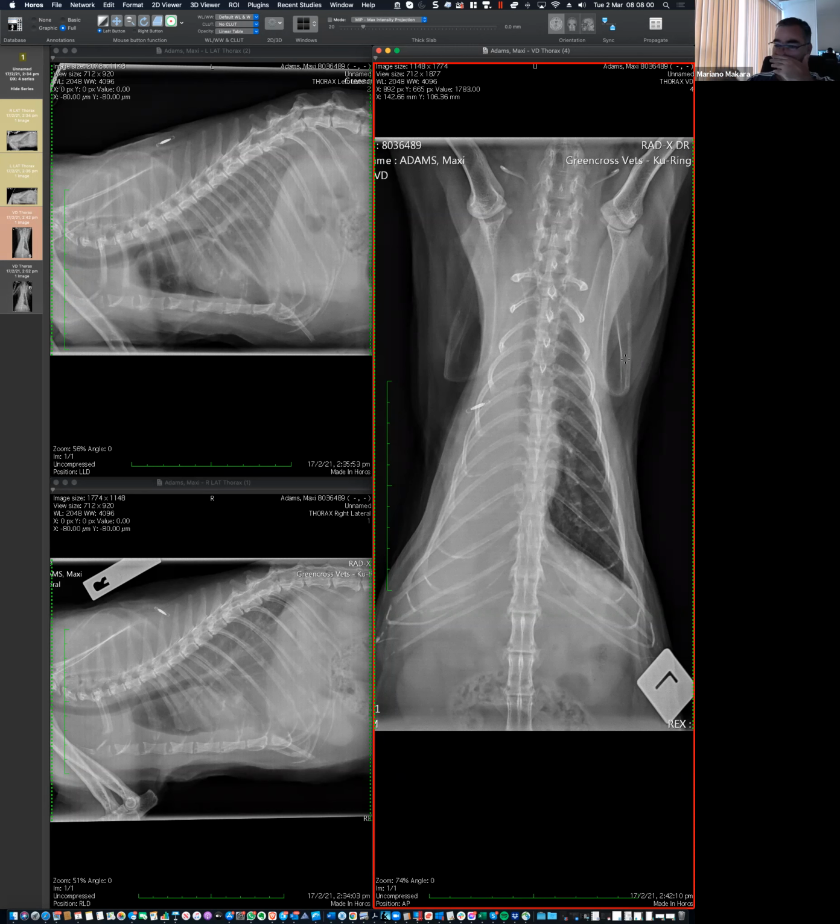And then the exercise is going to be trying to decide where it is anatomically, and the following step is going to be, well, how can we explain it? Which kind of disease process can result in this? The left hemithorax has also got an interstitial pattern, particularly caudally. It almost verges on saying nodular interstitial. That's probably sticking the neck out a little bit.